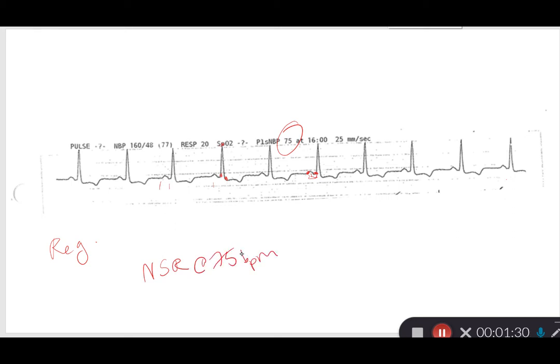One thing that does make this rhythm look a little different is our T wave. So we can see here that our T wave is upside down, it's inverted. Whereas usually we would see our T wave be an upward stroke, ours is going to be an upside down stroke. And we do have some ST segment depression. So I marked over here my QRS. So my QRS complex ends here.